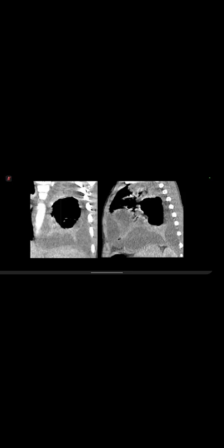And then a couple more questions. How can we differentiate congenital lobar emphysema from bronchial atresia? That is a very difficult differential, I really admit that, and you really need a CT stack to make sure. For example, this was a case of bronchial atresia, and I apologize for the painful, slow scrolling of the scan. In bronchial atresia, usually the segmental or subsegmental bronchus is affected.